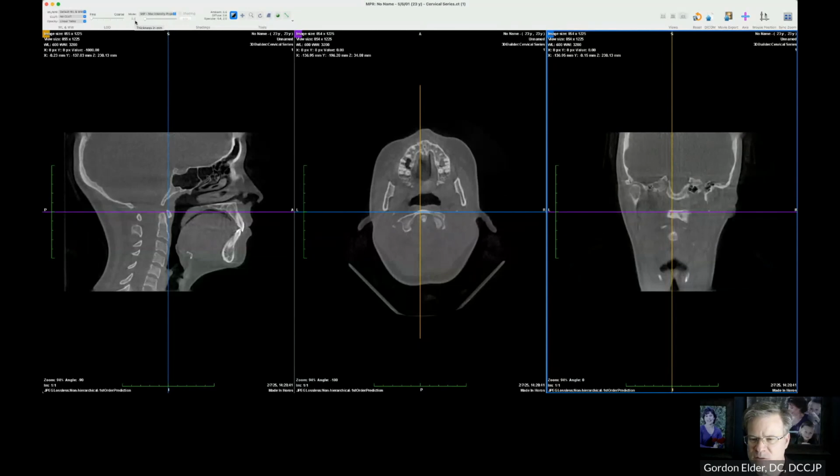It's going to be set at the smallest slice that the machine that took the image uses. The smallest slice that we took for this picture was 0.3 millimeters. That, according to the radiologist, is too small to actually look at things. So we're going to change that around.